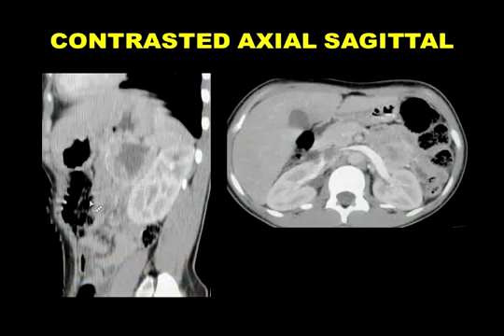Here I wanted to show the surgeons normally want us to tell them the invasion of organs. The left renal vein is normal, and this is not a thrombus in the IVC, it's just the phase and the mixing of blood at that point. But this mass, seemingly, to me was invading, showed some peri-fat stranding of the fat adjacent to the mass. However, the renal vein, the aorta, and the IVC didn't show any thrombus.